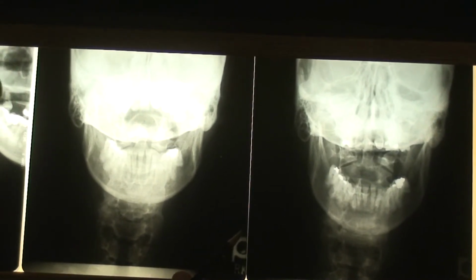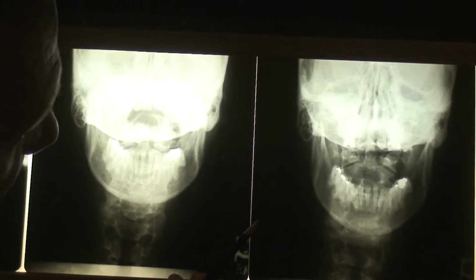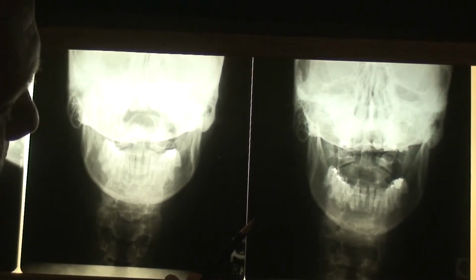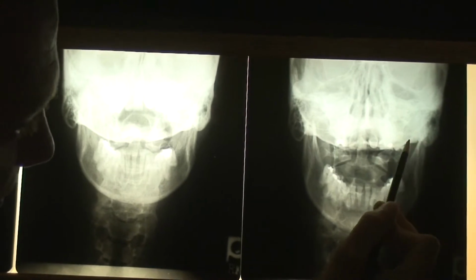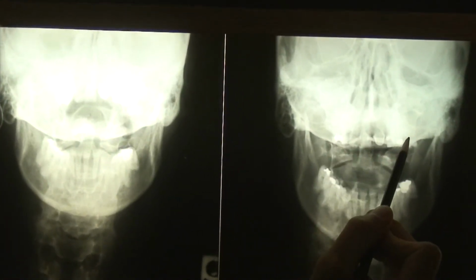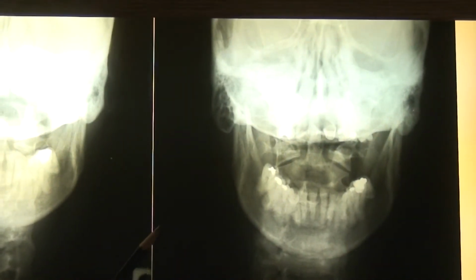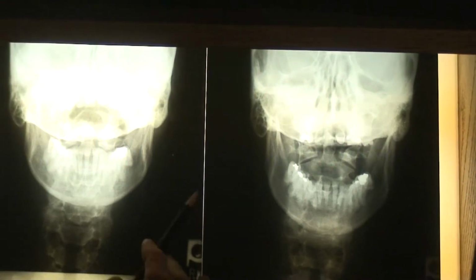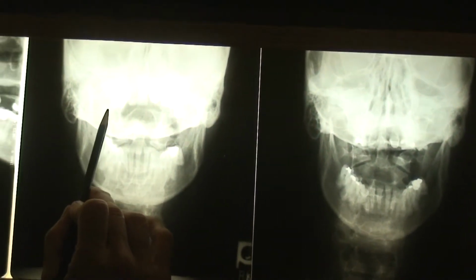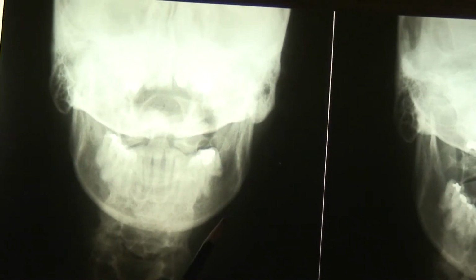But there's something even more important when we're looking at patient position for this X-ray, for the APOM, full cervical, is the position of the teeth. The teeth should come down and strike the top third of the atlas. When I have doctors send me films and they have a confusion on their listings, you'd be surprised at how many times they send me a film that the teeth are considerably higher than the atlas lateral mass.